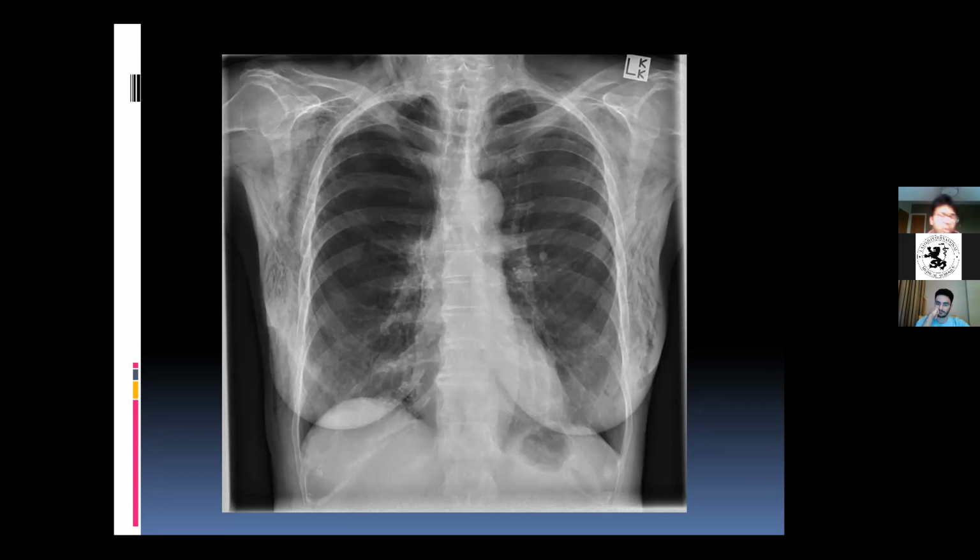Subcutaneous emphysema that you can see all throughout on the right-hand side. An interesting sign that you have to note is that when there is subcutaneous emphysema and there is no real tissue that the x-rays can be absorbed by over where the lungs are supposed to be, you can really visualize the pectoralis major fibers, and you can see them really well over here. The subcutaneous emphysema kind of digs into where you can spot the pneumothorax quite clearly.